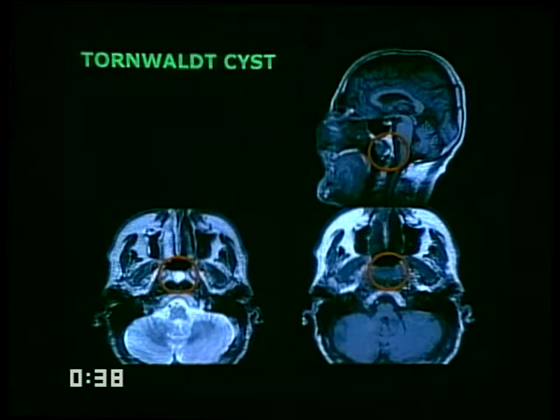An innocuous lesion we oftentimes see in the retropharyngeal space in the midline is a cystic structure which may or may not infiltrate the longus muscles around it. This is called a Tornwaldt cyst. It's quite common. It's seen in up to 1% of the population. For unknown reasons, it's more commonly seen in schizophrenics, and this may cause periodic halitosis.